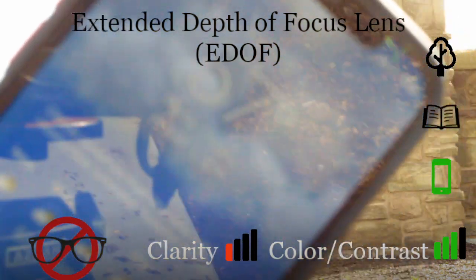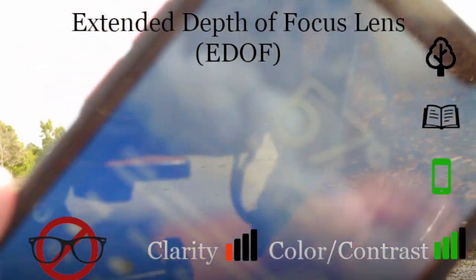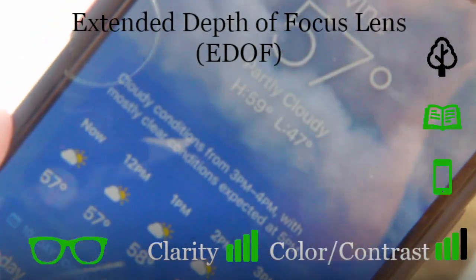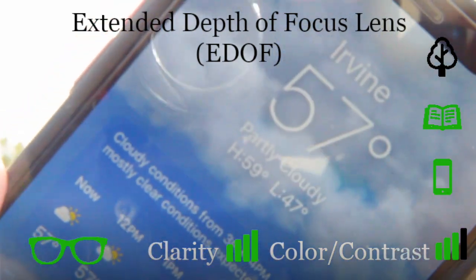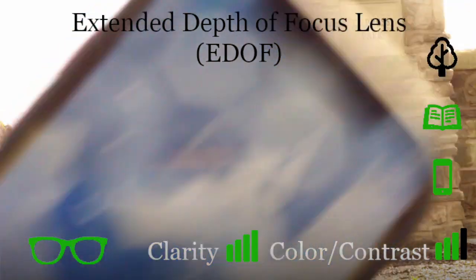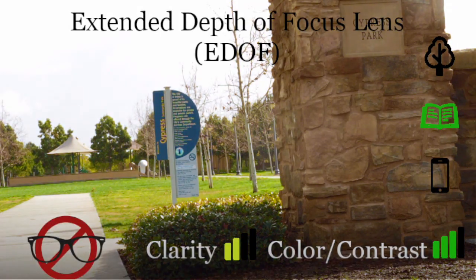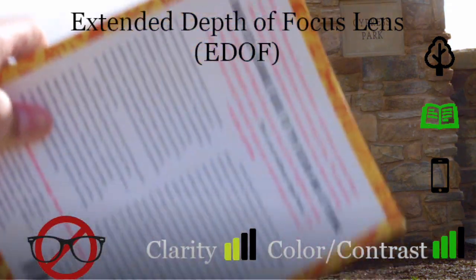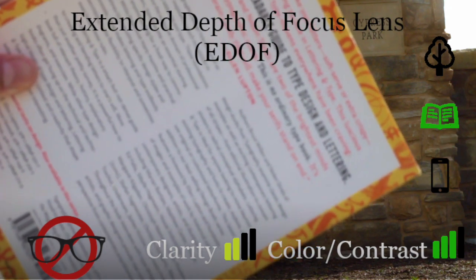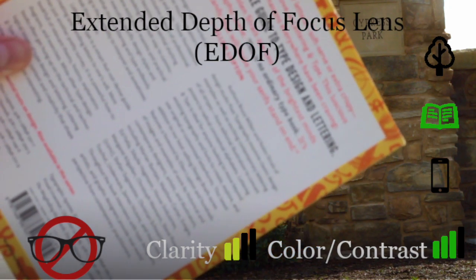So we'll reach for our reading glasses here. We'll put those on, just like so, and that should sharpen everything up. So with this lens, you still need to put on reading glasses to see very clearly up close. Glasses off, and we'll show that book one more time. So we have that book coming up here at arm's reach, and we can still see some of the larger words, and that's the benefit of this lens without glasses.